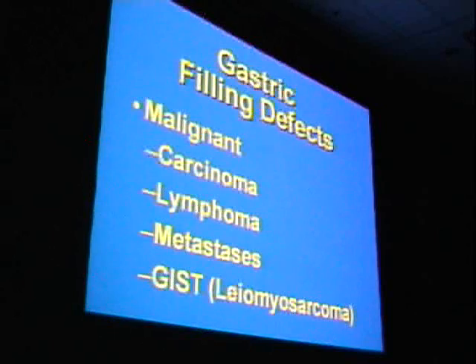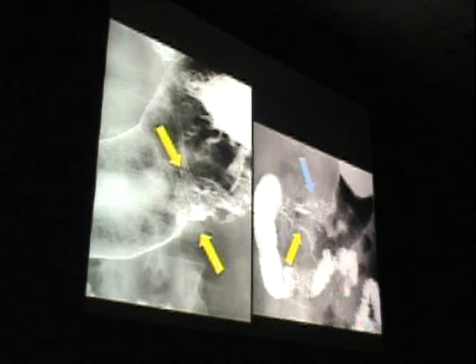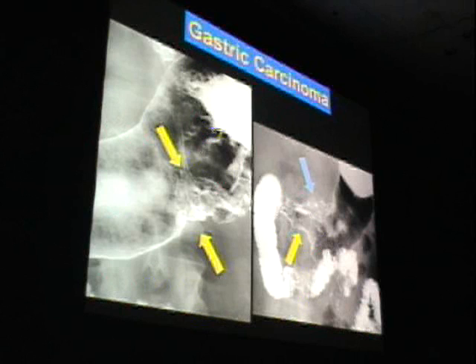Most of the time, here's a polypoid lesion on your left and a circumferential antral lesion. Both of these have significant ulceration, and both of these are gastric cancers. Not a real problem here. What's in the differential? Well, you have to consider lymphoma. You have to consider mets. But I wouldn't think of GIST or significant metastatic disease or other things like that, because basically these look like primary mucosal lesions, lesions that are destroying the mucosa. Therefore, the most likely diagnosis is adenocarcinoma.